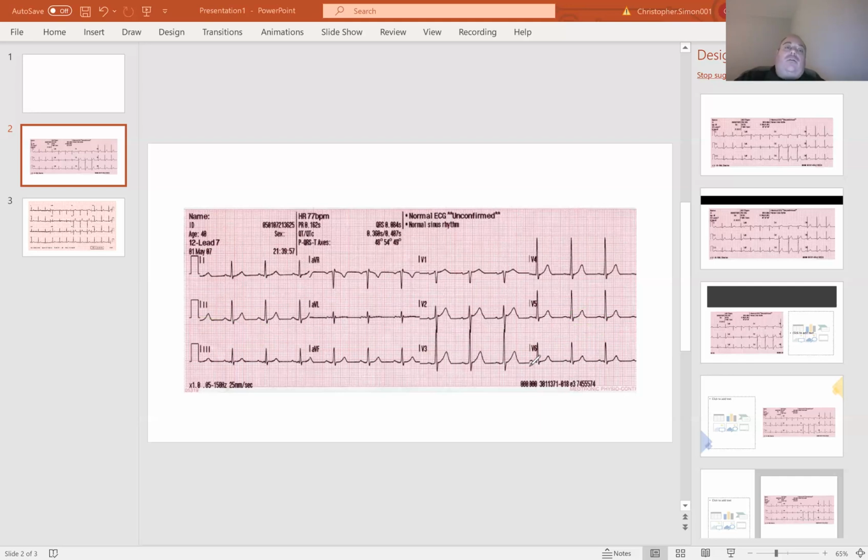Okay. So the 12 lead that you're looking at is most likely from a LIFEPAK monitor that they use in fire rescue, EMS, stuff like that. You do see them in the hospitals occasionally, mostly attached to code carts and stuff. But not all 12 leads look the same. So I wanted to show you a couple different ones just so you can see what I'm talking about.